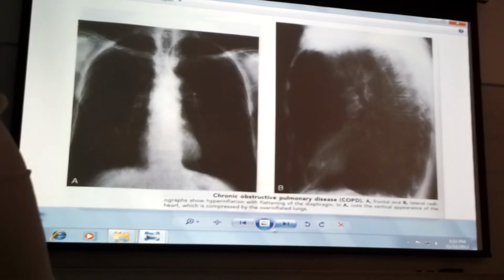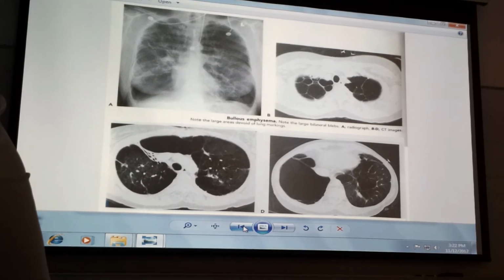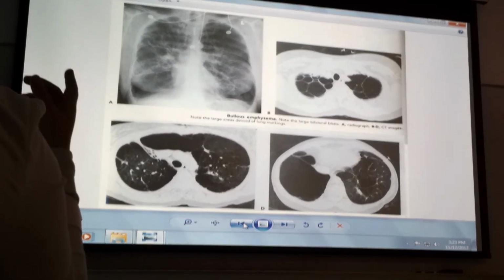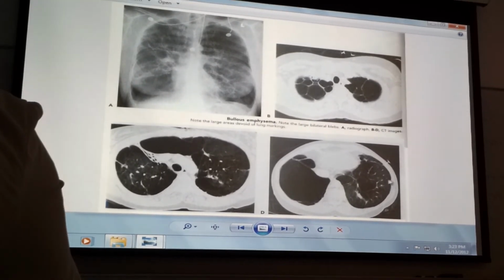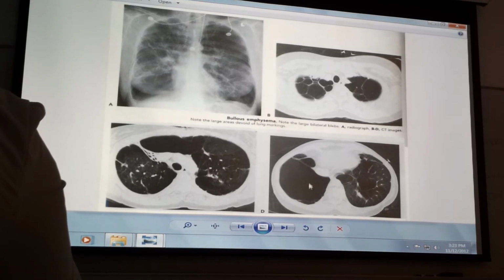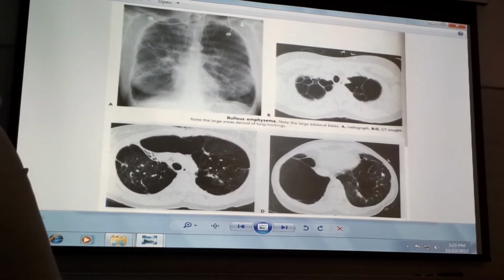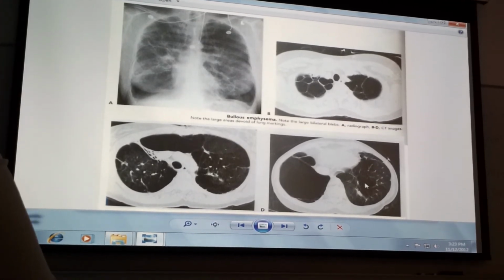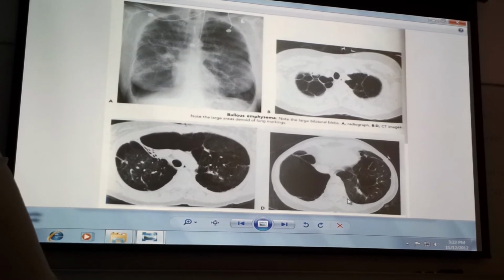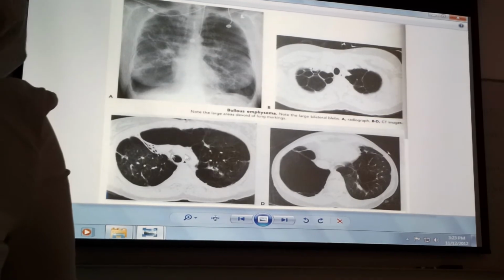Would you go back to that for a second? Yeah. Please? Yes. Wow. Okay. Wait, do the lungs look smaller, or is it just... You know what? It's not a question of the lungs being small. There's no parenchymal pattern due to bullae formation. The actual volume may be larger, but there's no lung capacity because this is all large bullae formation, as opposed to this side, the left side, which has some bullae but normal parenchymal patterns. But this is all full of bullae. This alters a normal appearing chest X-ray.